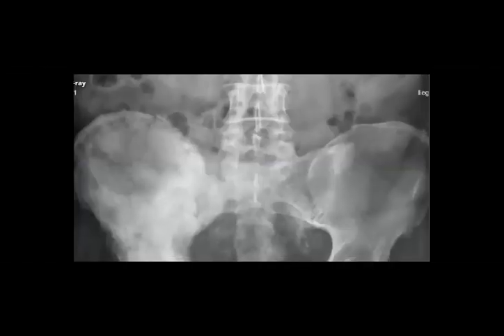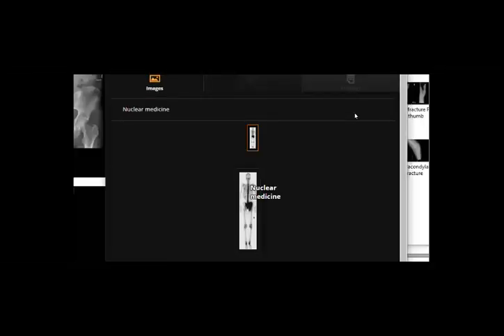I want to just show you the nuclear scan. I don't know why it's small. Okay, but you can see, I don't know why it is smaller in size. Anyway, you can see that the uptake is like this, focusing in this. So I see that Nermeen suggests Paget disease as well. So this case was Paget disease. Perfect.